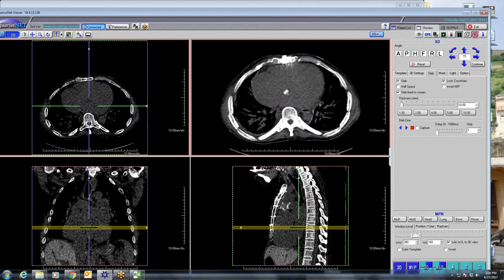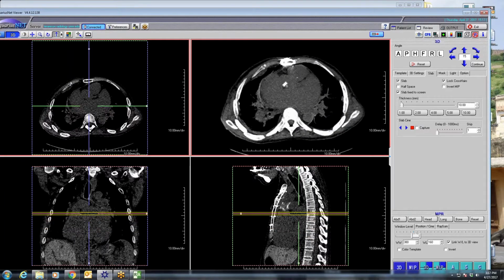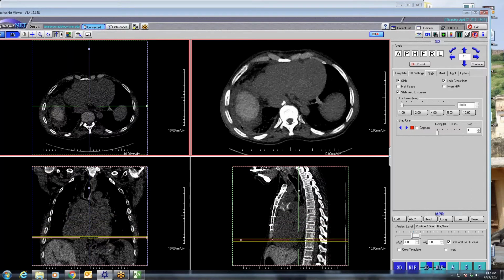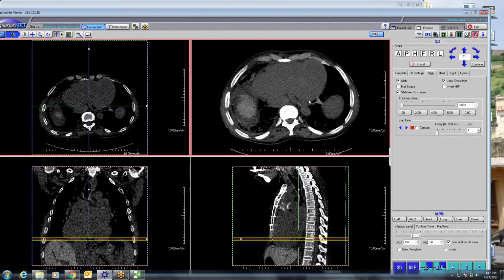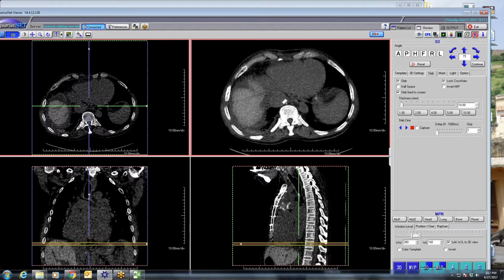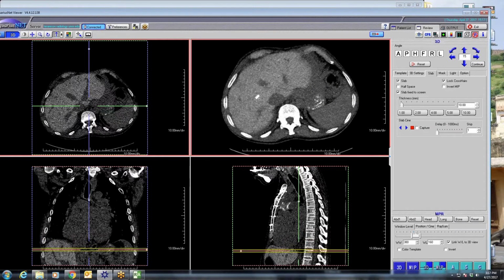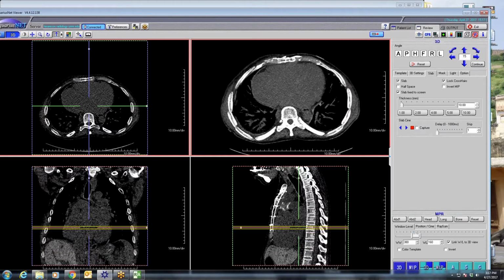Yeah, I've seen the classic ones that involve the lungs, like one or two cases, and they're pretty impressive. I don't know at what point you call it. I didn't mention it in the lungs. I just kind of blew it off and called it atelectasis, and I buried it, saying maybe there's some amiodarone toxicity in the lungs. I kind of left it because the liver is so clearly involved, and the guy is pretty much crumping because of his complete absolute heart failure.